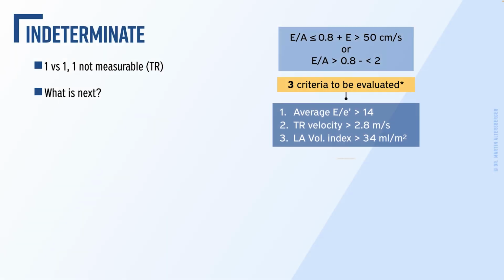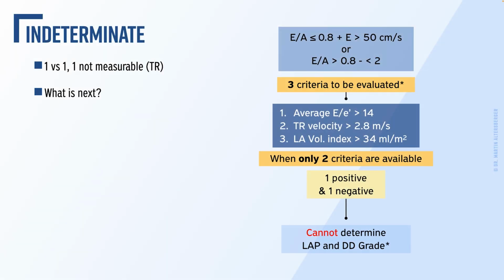One of the, for me, best measurements of diastolic dysfunction is left atrial strain. It's a bit of a new kid on the block, and we already discussed the pulmonary venous signal. It can help to determine left atrial filling pressures or left ventricular end-diastolic pressures if there is no mitral stenosis present, and it also can help grade diastolic dysfunction.